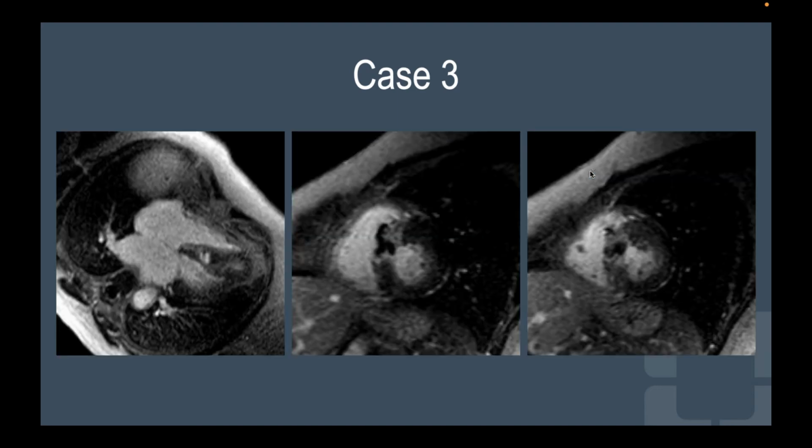Third case. This is a composite of images, but let's look at the first one. So who wants to describe the sequence and what we're looking at?